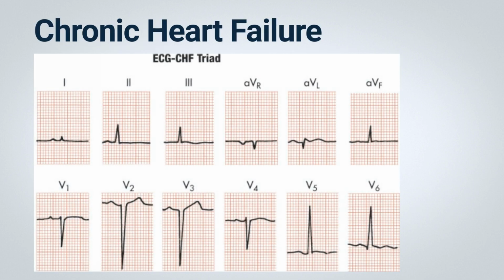Chronic heart failure, also known as congestive heart failure or simply heart failure, is a complex syndrome that can be attributed to various causes, including myocarditis, extensive MI, systemic hypertension, valvular heart disease, and cardiomyopathy. The ECG can offer helpful clues for diagnosis in some of these patients. Prominent Q waves and typical ST-T changes may hint at underlying ischemic heart disease with extensive infarction. Left ventricular hypertrophy patterns could signify hypertensive heart disease, aortic valve disease, stenosis or regurgitation, or mitral regurgitation.